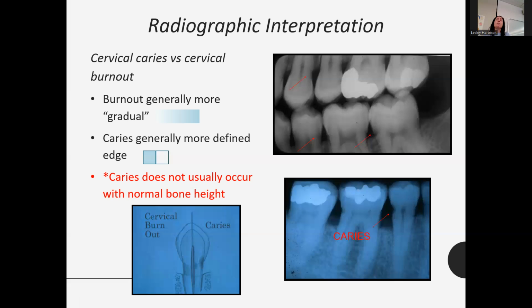If there's healthy periodontium, it's likely not root caries. Root caries is far more common when there's periodontal involvement and bone loss. So like the distal one, that's more distal burnout along the margin there, on the bottom. The distal. Right here? Yeah. That's probably more cervical burnout because you can see how it comes in.